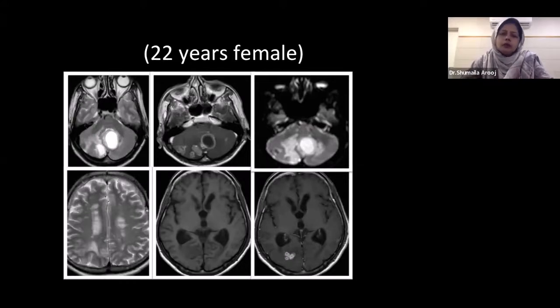I did not place it because I have limited space on my slides. But whenever you are looking at a DWI, you can't comment on a DWI in isolation. You need an ADC map side by side in any case. For example, you are looking at an infarction and you have to age that infarct. You need DWI and ADC side by side to decide whether it is an acute infarction or subacute, or a chronic established infarction.